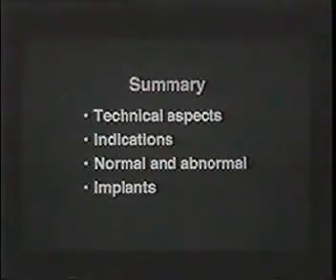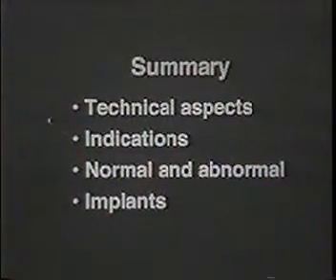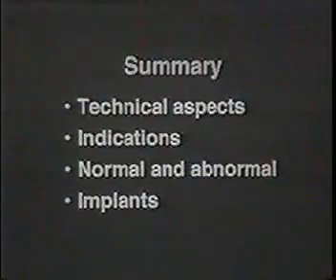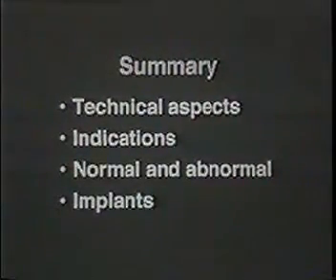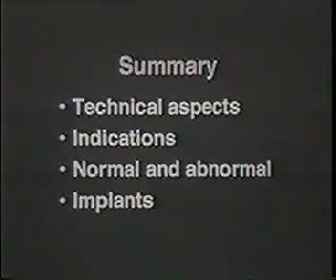So in summary, we've looked at some of the technical aspects of sonography, the indications for this examination according to new appropriateness guidelines. We've looked at normal and abnormal ultrasound of the breast, and we've seen how it works as a tool in the evaluation of a symptomatic woman with a problem with silicone implants.